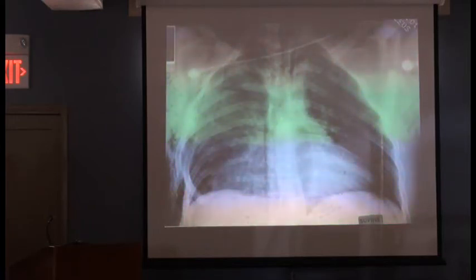It's just Sesame Street. Which one of these is not like the other? This isn't like this, all right? So this is actually a pulmonary contusion because you can see it outlined nicely. And clearly the rib fractures are here. What's all this black stuff? Remember, black is what? Well, yeah, exactly, Sandy. This is also clear, right? All right, does that make sense?